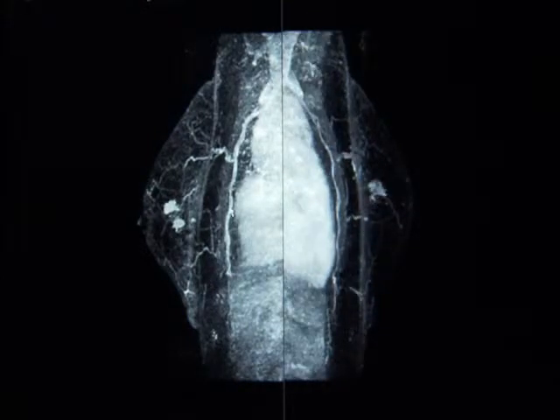This hanging protocol is designed for our sagittal parallel imaging sequences. This is probably the most challenging pulse sequence to design a hanging protocol for, as we always like to look simultaneously at what's going on in the breast. We designed this such that we could look at both the sagittal 1-minute MIP for each breast side by side.